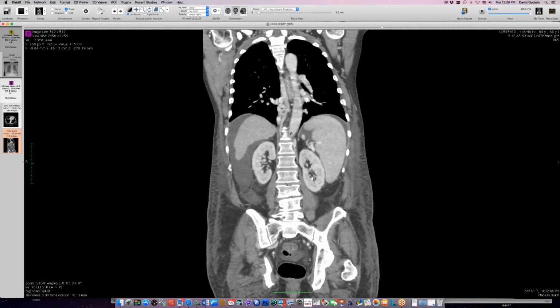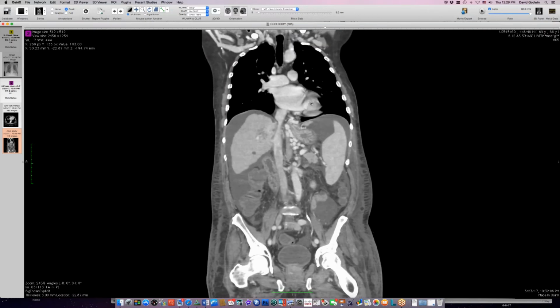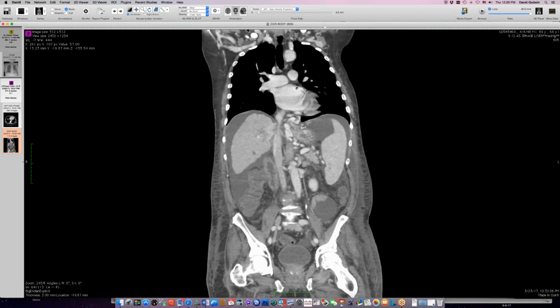Is this pulmonary artery enlarged? I've seen that in a lot of these patients with portal venous hypertension, and I presume it's from increased flow. The liver normally acts as a giant resistor. This doesn't look that big. The pulmonary arteries aren't that impressive here. So you're saying that the portal hypertension leads to pulmonary hypertension? Yes. Some of it may be humoral, but you'll see they have big azygous veins. I think of the liver as a giant resistor for the systemic venous system. I'm wondering if he had that as well, or if maybe he's decompressing through these varices instead, and the left heart's dealing with it.